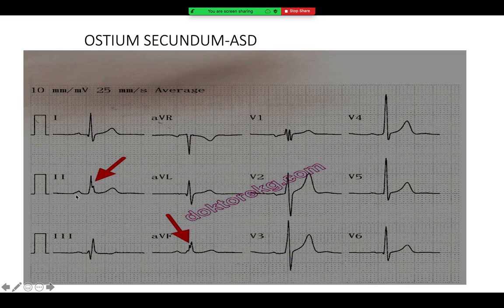If you will notice, it does cover a small box at least. For example, especially in the lead 2, if you will notice over here. Okay, and how about the QRS? There are some arrows as well which have been put up to make it easier for you. So QRS is definitely prolonged, yeah.